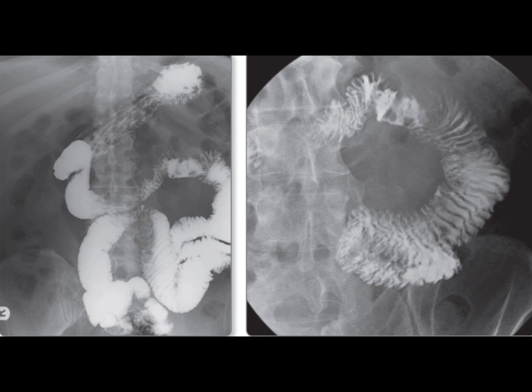However, the prevalence of such cases in exams often doesn't reflect real-life scenarios where more esoteric and unusual cases are encountered. It's essential to familiarize yourself with the varied manifestations of Crohn's disease, particularly through small bowel barium studies, as these can often present as long, obstructive segments confined to the pelvis.